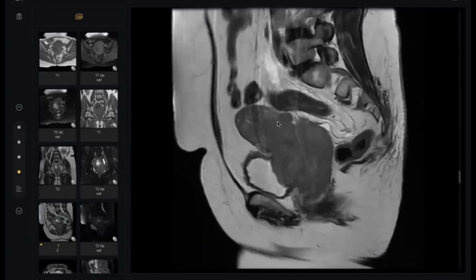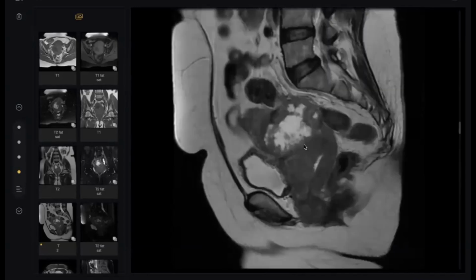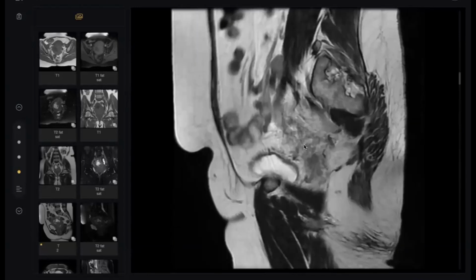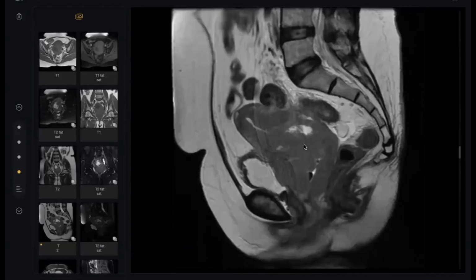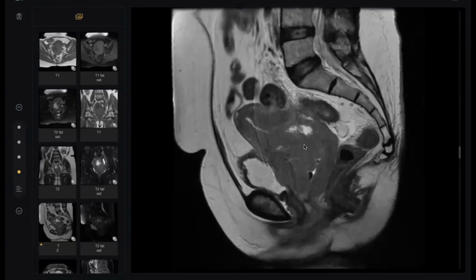Yes, doctor. There are common lesions here in the cervix. So, give me a diagnosis. So is this cervical cancer? Yes. Okay. Give me the local staging, please. So you have a FIGO classification for cervical cancer. Give me which grade for this case. 2B and above, because I believe the parametrium has been invaded, and it's quite extensive. And there's hydronephrosis, so it would be stage 4, wouldn't it?